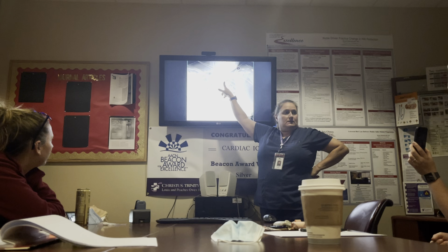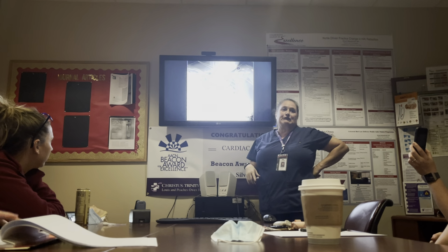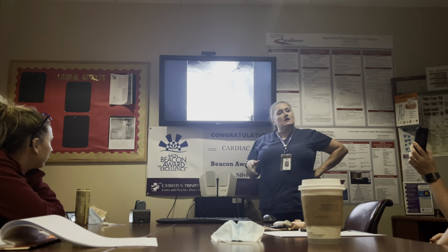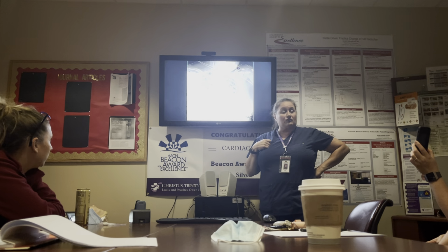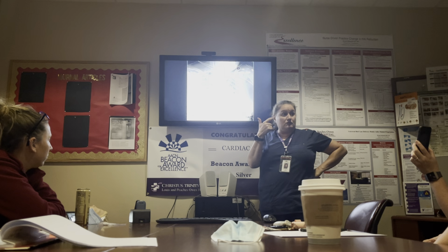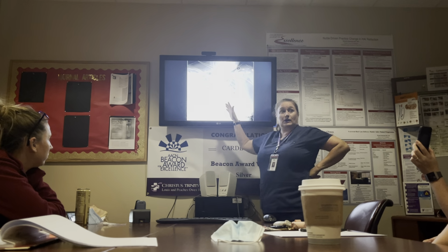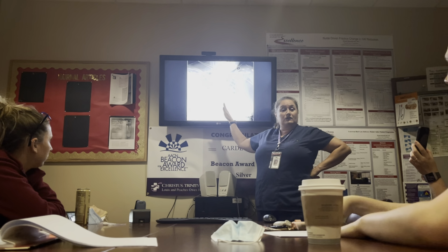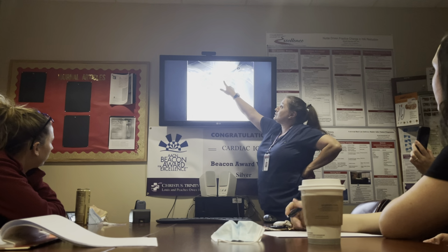So the thing I want to show you guys, it's in the right position. When I get called and they're starting to develop some renal failure and they don't look like they're coming off the vent and we've got them on balloon pump, what is the first thing I come look at? I usually look at the chest x-ray. I look for the placement of the endotracheal tube, I look for the placement of the balloon pump. Because as you all know, if the balloon pump migrates down, it's gonna block off the renal arteries, and what are they gonna do? They're gonna get kidney failure, okay? So this is a good placed balloon.